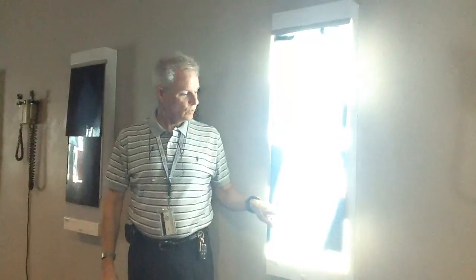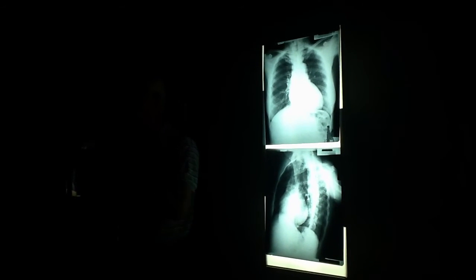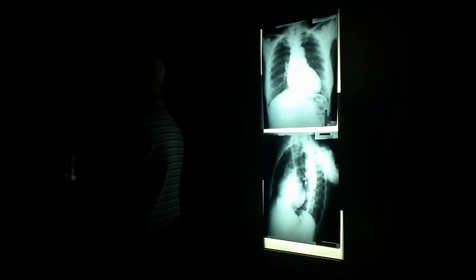This is an LAO, and the aorta goes like this, because we get a lateral view of the aorta. Remember the aorta, right anterior to left posterior. It's an oblique view when we look at the aorta on a PA view. When we go LAO, we get a straight lateral aorta. When we do an RAO, we get a frontal aorta. Because a PA view is an oblique aorta.